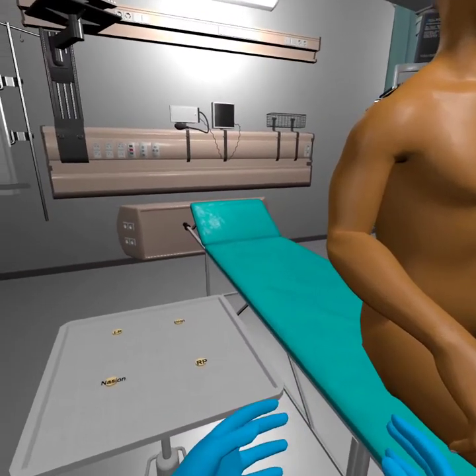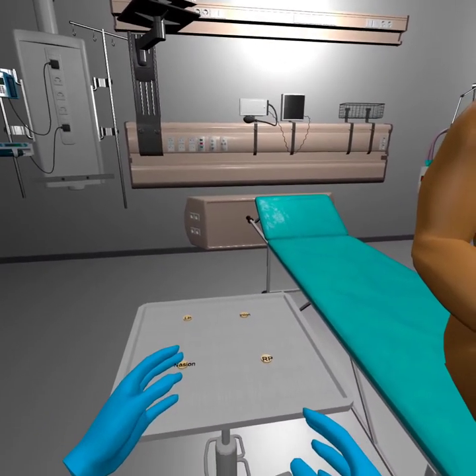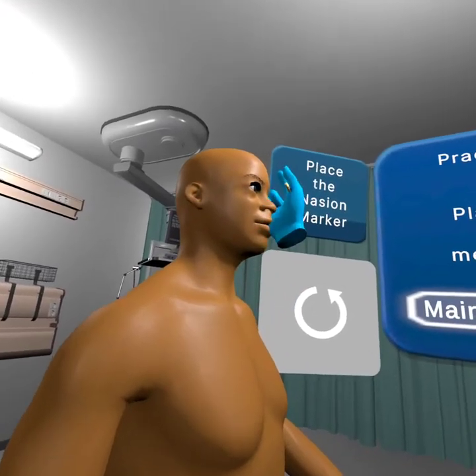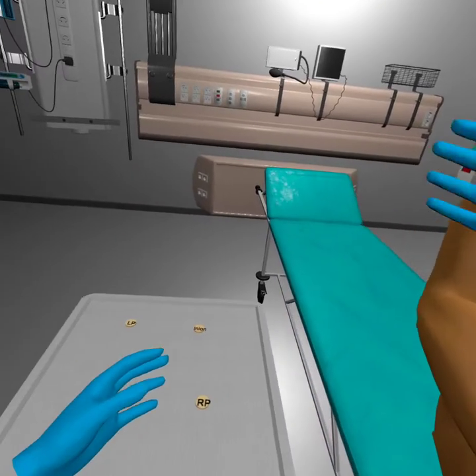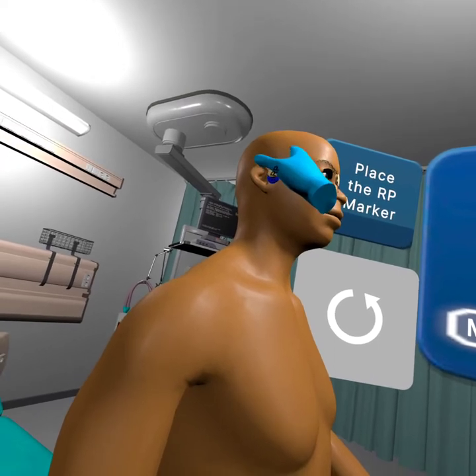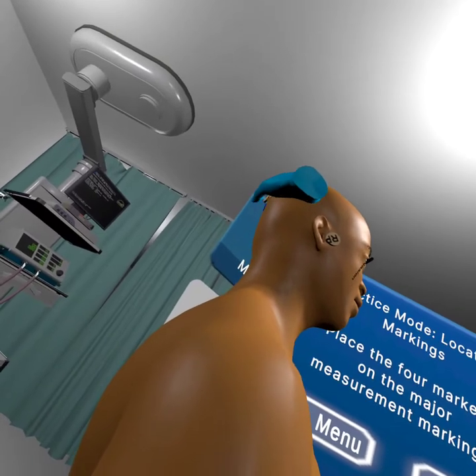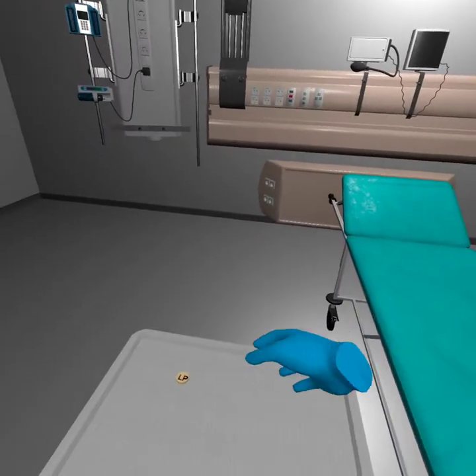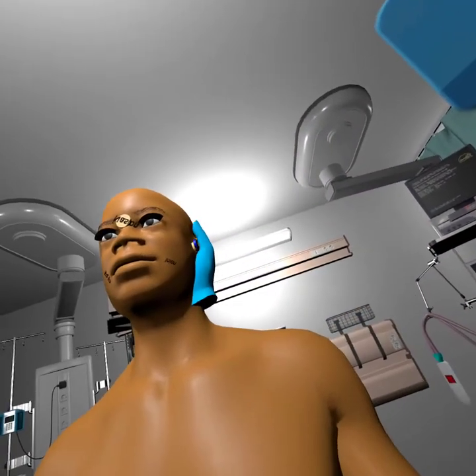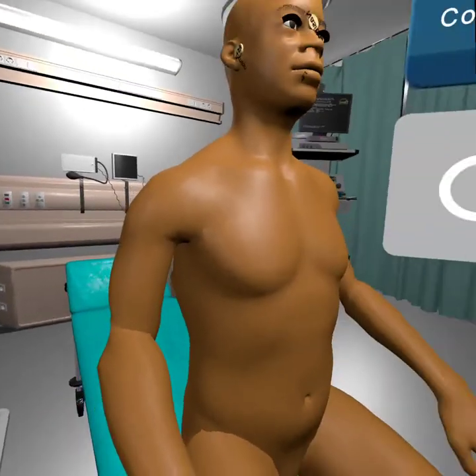In the simulation training mode, users are prompted first with markers to see if they remember how to start the 4 major locations. After the Nasion, they apply the right preauricular point, and then place the Inion. And then finally, place the left preauricular point. Users will have to move around a real room in order to navigate the virtual reality space.